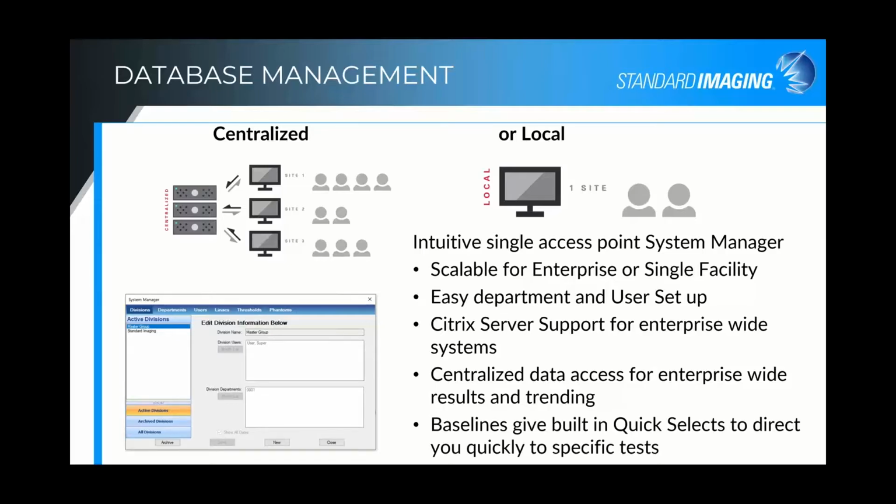And then we also set up baselines, and that gives you what we call quick selects, and I'll kind of touch on that in the software a little bit, but it gives you direct access to specific tests, so you don't have to set things up each time. You can just grab a quick select and get right into the testing.